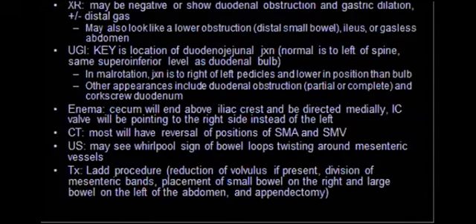Okay. And there is no contrast past distally, so it is malrotation with midgut volvulus. Perfect. Yeah. So there is dilatation of the first and second portions, and there is malrotation, and also some corkscrew sign. I agree. Okay, nice, perfect. So midgut volvulus is one of the emergencies that you should know about.